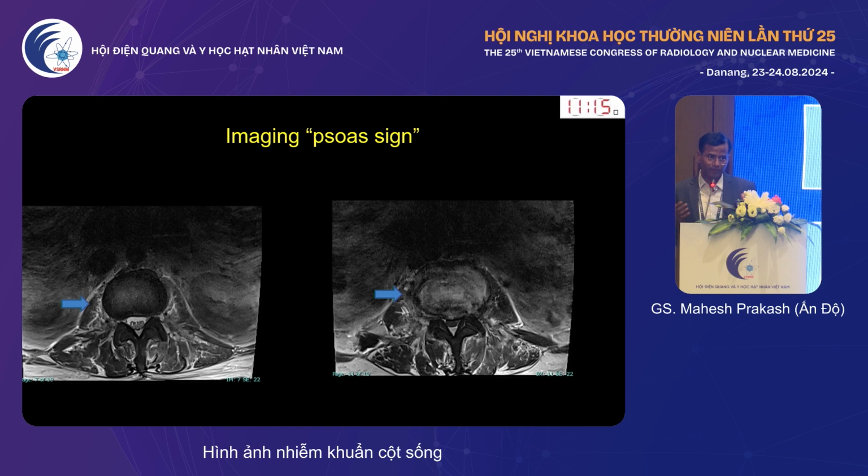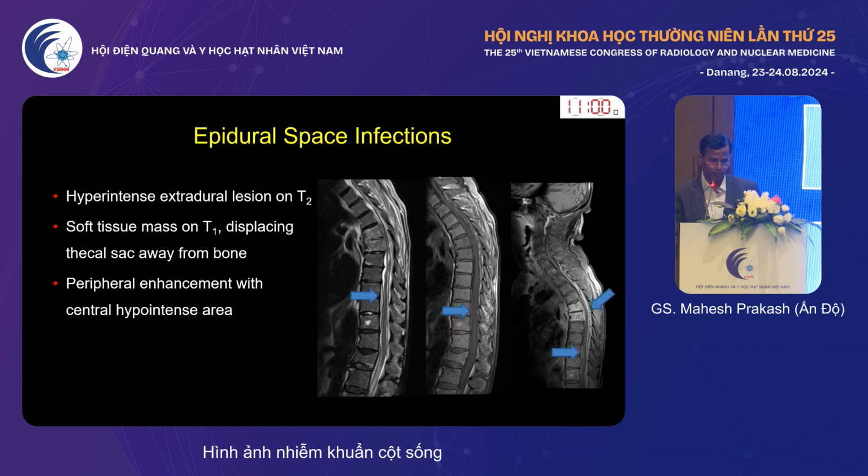And this is a wonderful sign you can use in your clinical practice to differentiate whether it is an infection versus degenerative disc disease, because many times it can mimic both the infection and the degenerative disease. So this is one of the important signs which you can use.